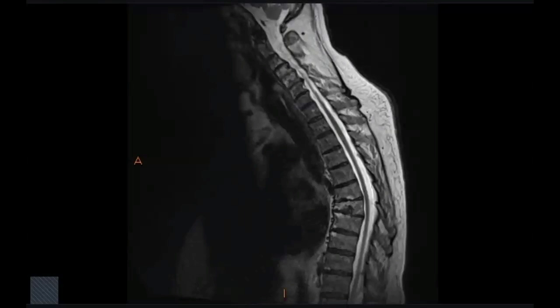Candidate 11, your case is a 70-year-old male patient with a 2-week history of progressive leg pain and difficulty walking. Great. So these are sagittal T2 weighted images of the cervical and upper thoracic spine of a 70-year-old patient who presented with lower limb weakness and pain. Can I have the remote control?